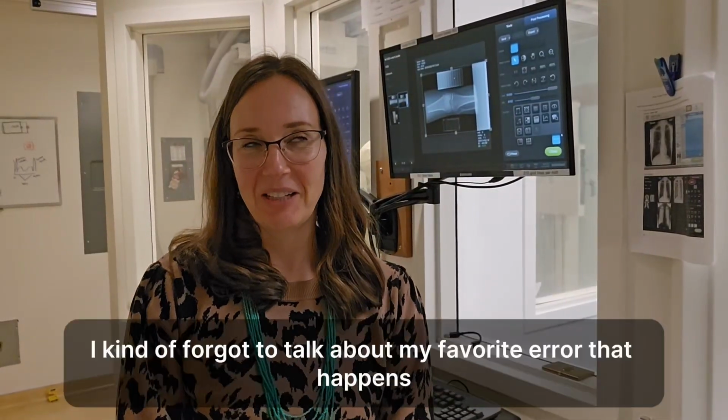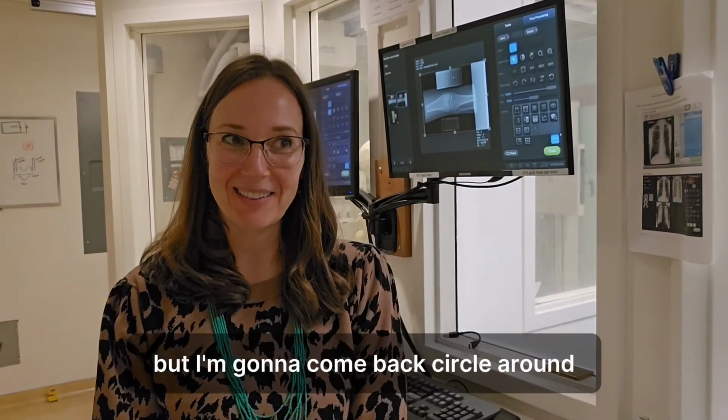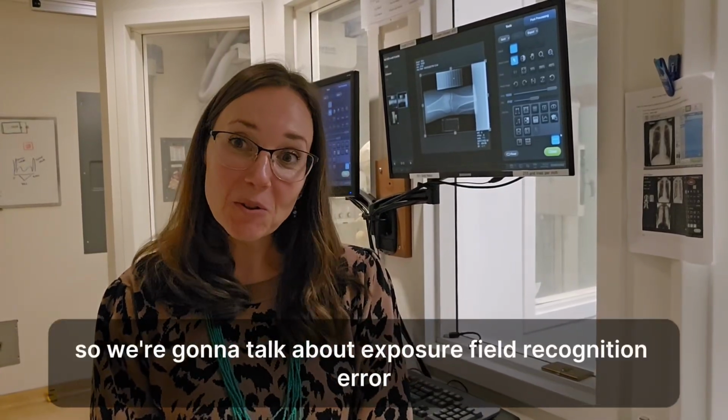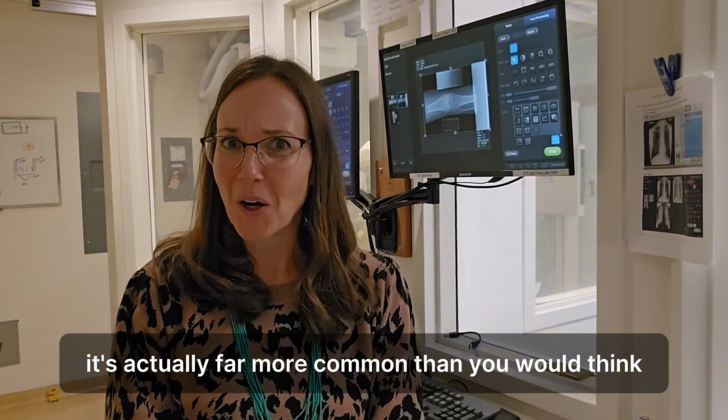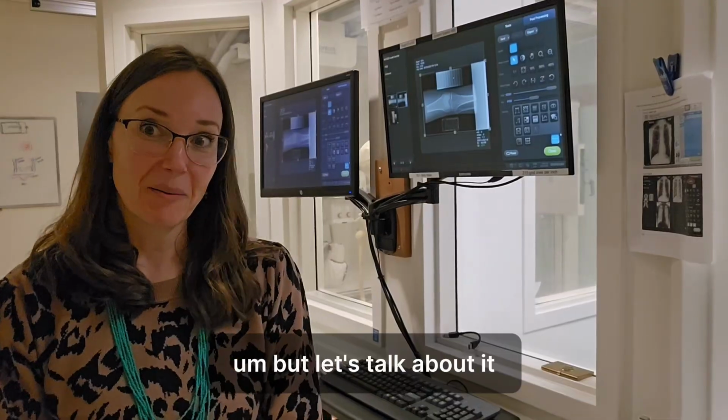So last video I kind of forgot to talk about my favorite error that happens, but I'm gonna circle back around and do it again really quick now. We're gonna talk about exposure field recognition error. It's actually far more common than you would think, but let's talk about it.